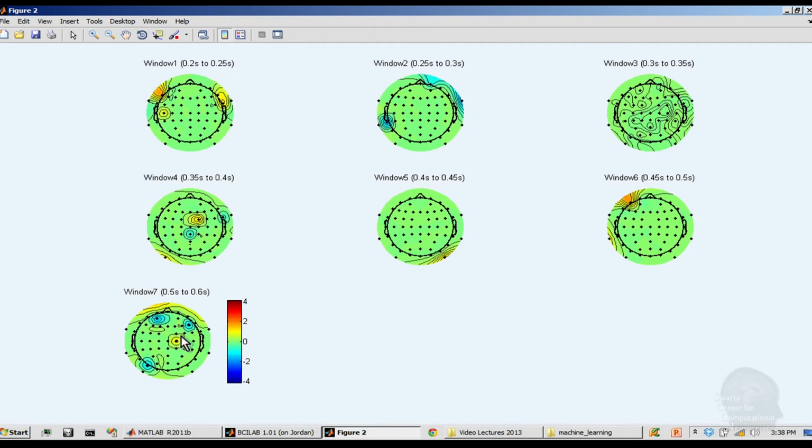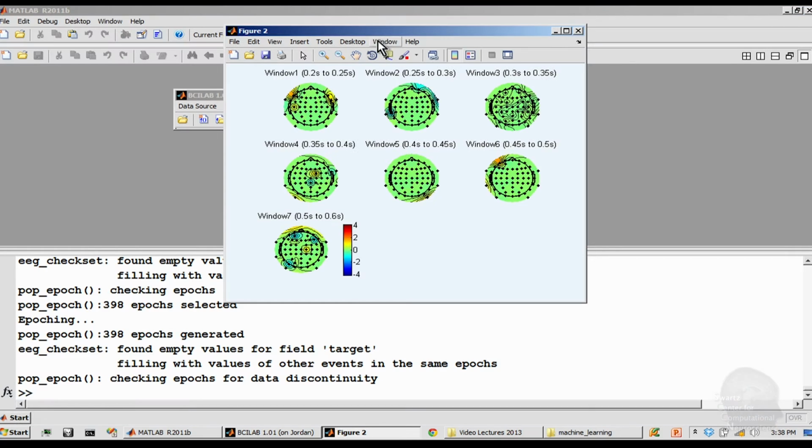In particular, it only uses a few channels up front here, and something here, and whatever, probably an artifact channel. So basically, you could remove all these other time windows, and you can remove all the other channels, and run this whole approach with just something like 5 channels, and get your 11% error or so. So that's actually not too bad.